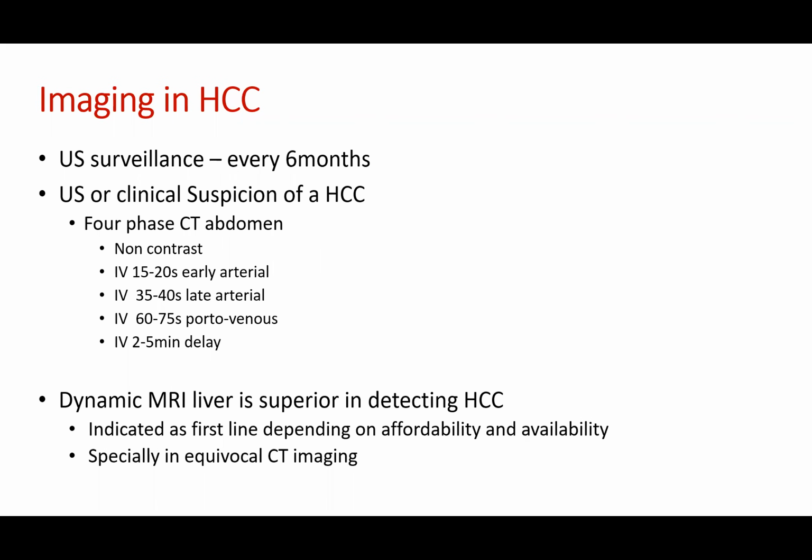Yes, exactly. Diffuse HCC is very difficult to detect on ultrasound, as is a very large lesion. I have seen a few patients where, even retrospectively, it was very difficult to understand. If you have a very big lesion occupying the whole of one lobe, it might be very difficult to differentiate on ultrasound. But as you said, if there's high clinical suspicion, you always have to do cross-sectional imaging, at least a CT.